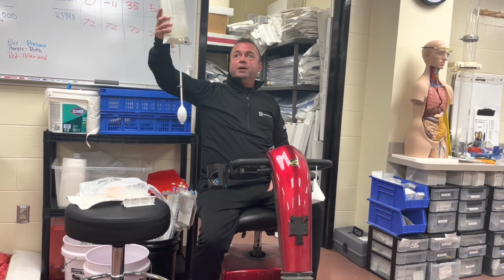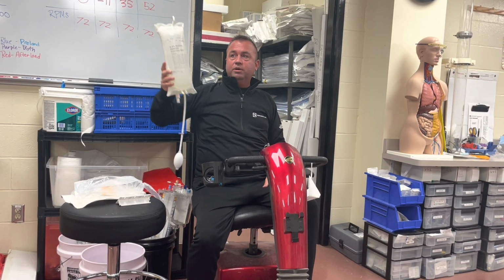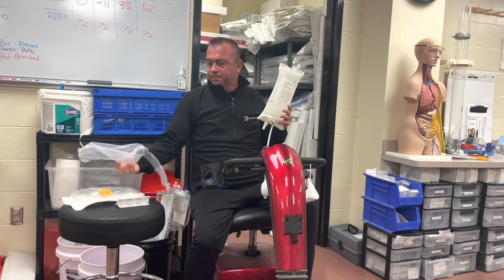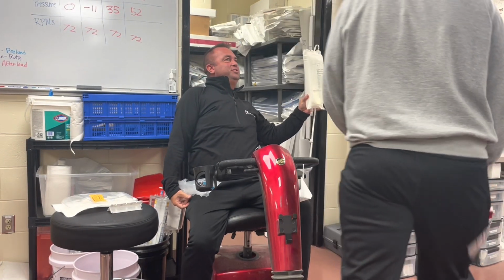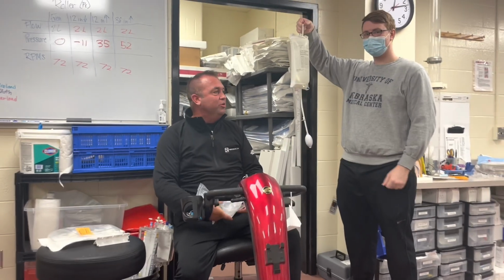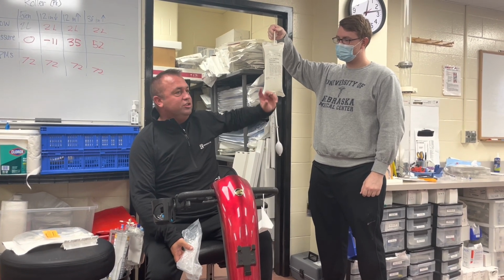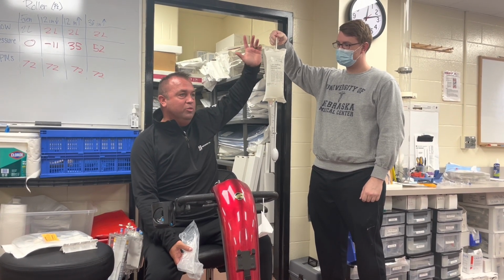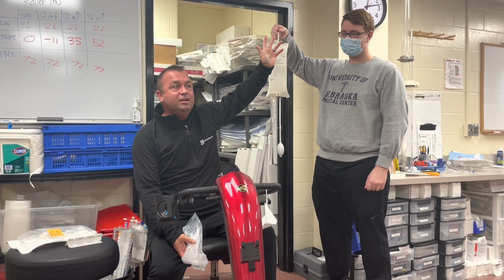So, bottom line is, we've got our bag right here and ready to go, right? Steven, come here. You're my IV pole, right over here. Since you're so tall, Steven's IV pole. Now, normal fluids running in, does it matter how high or low we put it on an IV pole on normal fluids? Not really, as long as it's above.